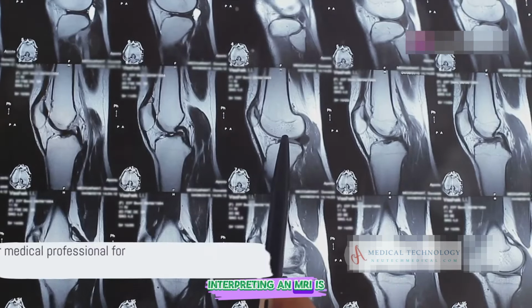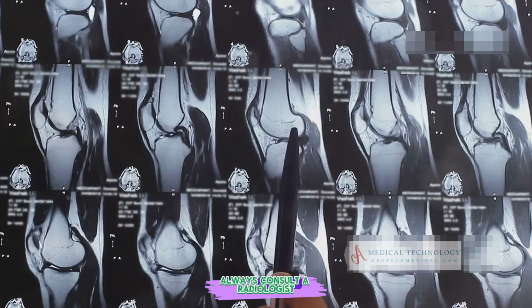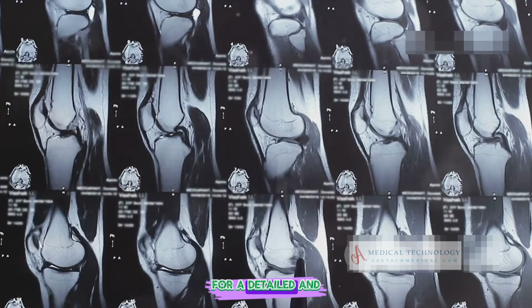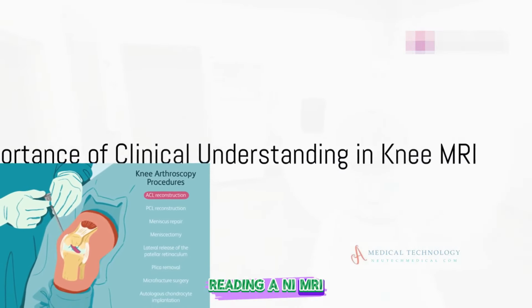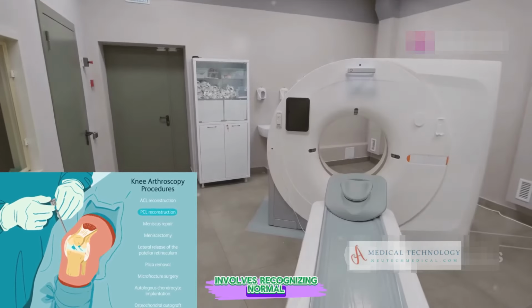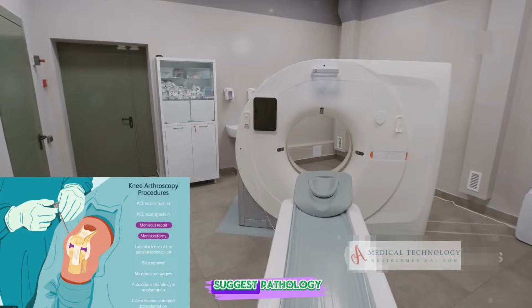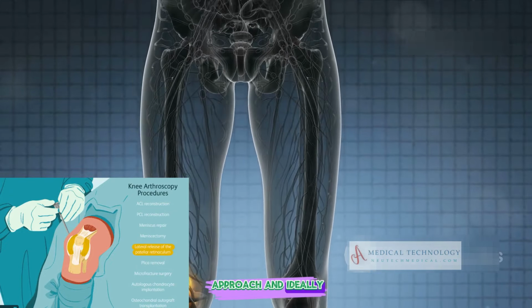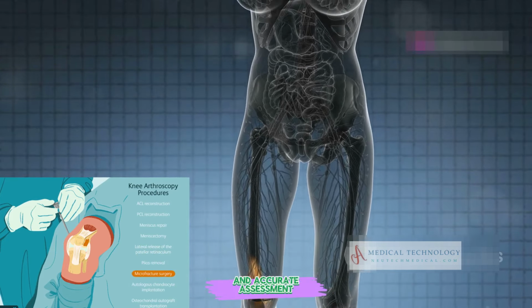However, interpreting an MRI is complex and requires expertise. Always consult a radiologist or a medical professional trained in imaging for a detailed and accurate diagnosis. In conclusion, reading a knee MRI involves recognizing normal anatomical structures and identifying deviations that suggest pathology. It requires a systematic approach and, ideally, guidance from experienced professionals to ensure a thorough and accurate assessment.